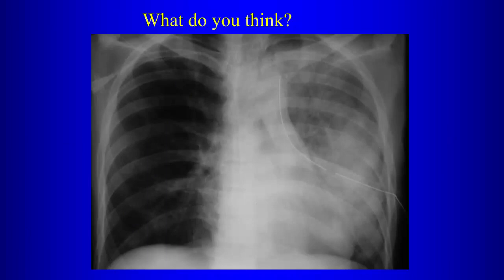Normal or abnormal? Chest x-ray. So is the x-ray normal or abnormal? Let's start there. Abnormal. Thank you. What's wrong?